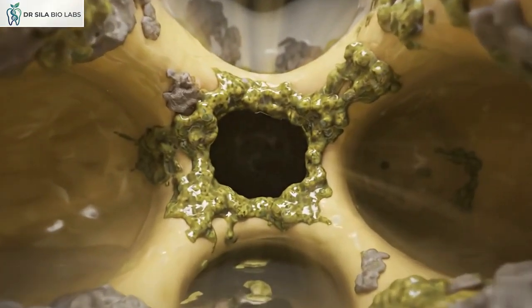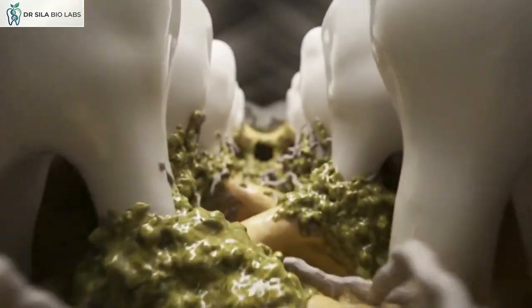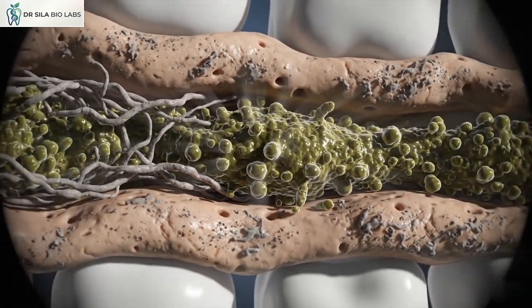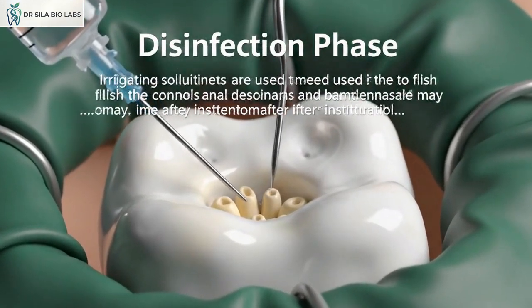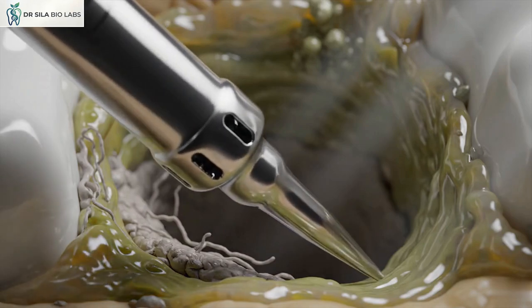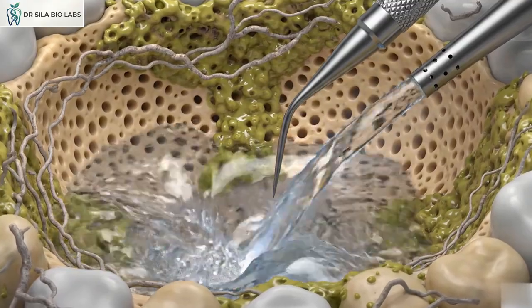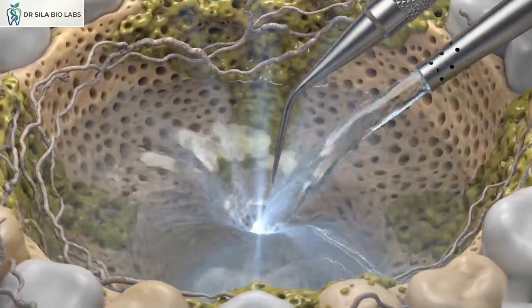Cleaning and shaping alone cannot completely eliminate infection from the root canal system. For this reason, thorough disinfection is a critical step in root canal treatment. Irrigating solutions are used to flush the canals and destroy bacteria that may remain after instrumentation. One of the most commonly used irrigants is sodium hypochlorite, which is highly effective at dissolving dead tissue and killing microorganisms.